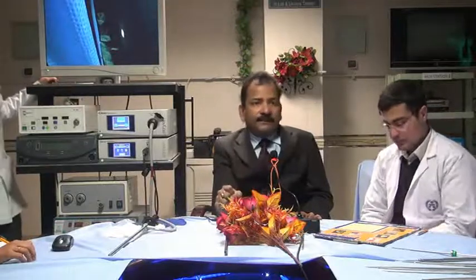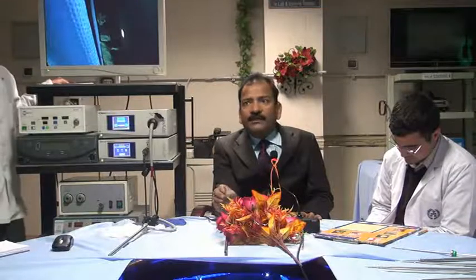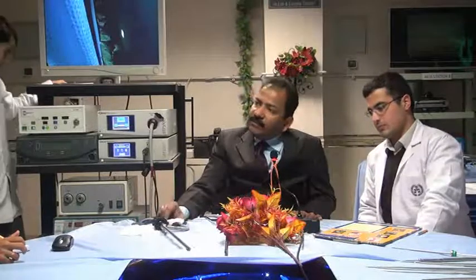Now, there are two types of HD. One is pseudo HD, another is true HD. Ideally, for your laparoscopic surgery, you should buy the true HD telescope and true HD camera. Unfortunately, some camera companies, especially some Indian companies, have launched 720p, that is pseudo HD.